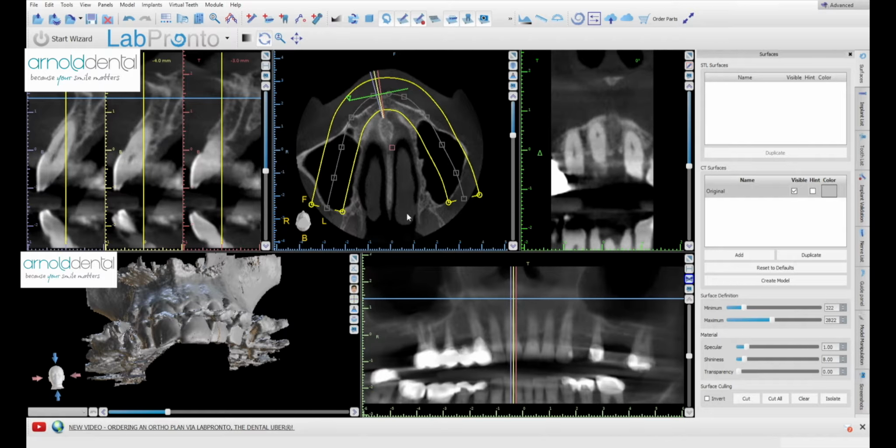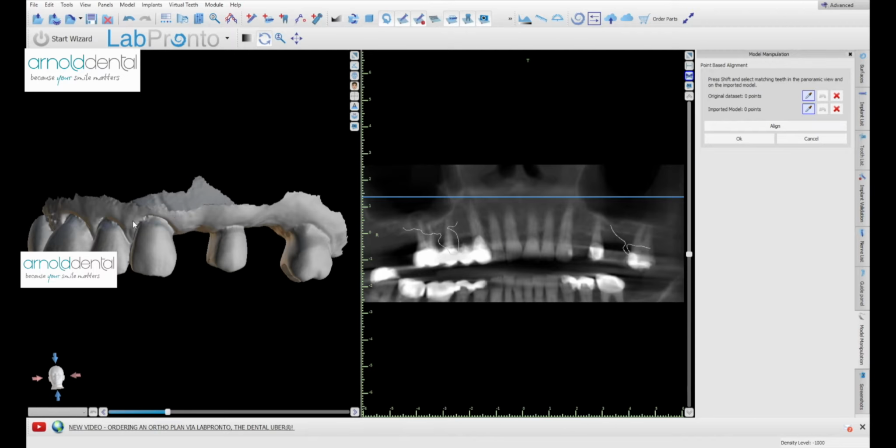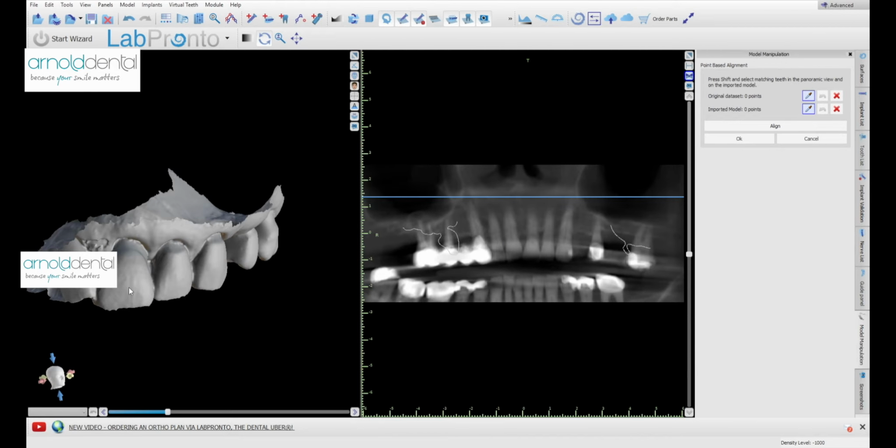I'm happy with this curve we've drawn. In the center of the screen, you can see that yellow line, which gives us an image in the lower right-hand side, almost like an OPG, laying out the dentition flat. The scan was really good to show us there was an area that needed a bit of help on the top left-hand side, which we've addressed now.